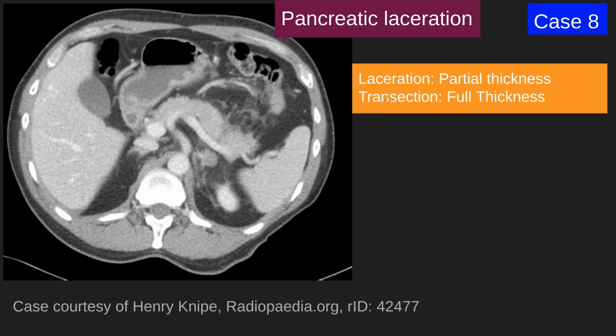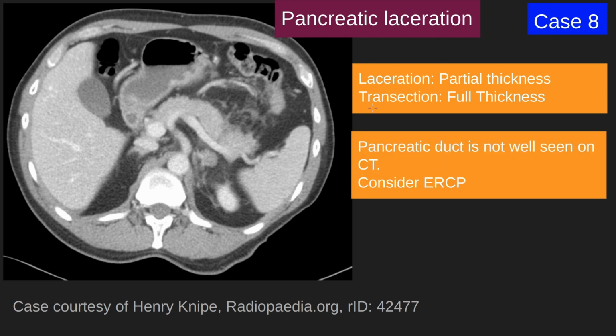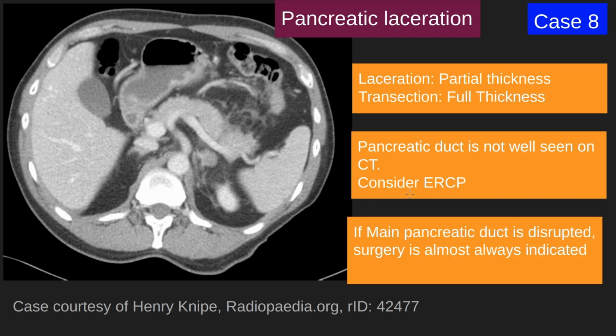In terms of classifying the laceration, if it is partial thickness, it's called a laceration. If it is full thickness, it's called a transection. In terms of main pancreatic duct involvement, if there is transection, the main pancreatic duct is also injured. ERCP is better for evaluation of pancreatic duct involvement, and in those cases, most of the time, surgery is the treatment of choice if the main pancreatic duct is disrupted.